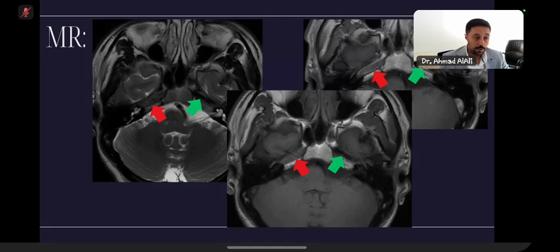Actually, these are multiple infarcts in the territory of the right middle cerebral artery. But they are scattered ones. They are scattered lacunar infarcts rather than a large area of large vessel occlusion. This indicates showering emboli. This internal carotid artery here is thrombosed, and it's sending small emboli to the terminal vessels or arteries in the territory of the right MCA. This contributes to the appearance of restricted diffusion and hyperintensity on FLAIR that you could spot at first.